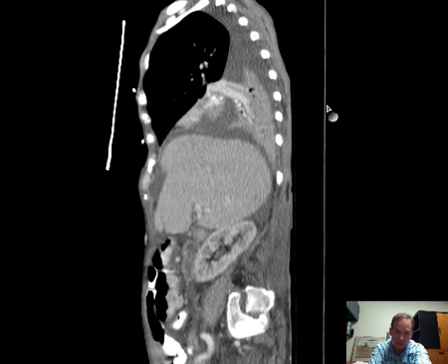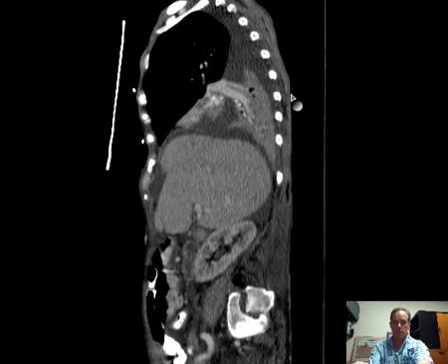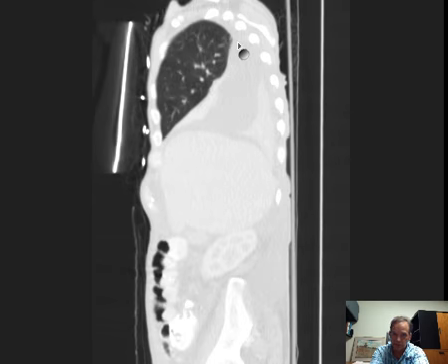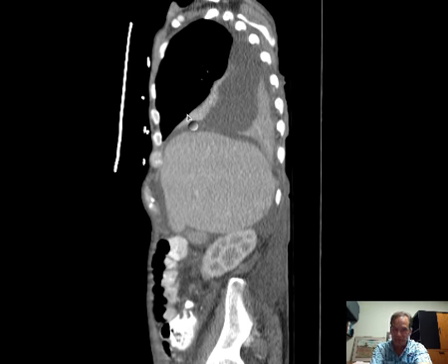from adjacent lung, right around here, let's say. So I think that the volume loss we have in the right upper lobe is relatively mild, and it's not really creating a compressive atelectasis. What it's really doing is just impressing upon the right upper lobe in this area, and therefore diminishing the overall volume in the right upper lobe, but not actually creating that atelectatic flattened appearance of the right upper lobe.